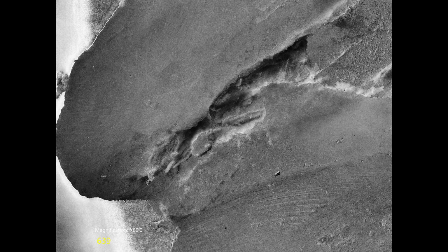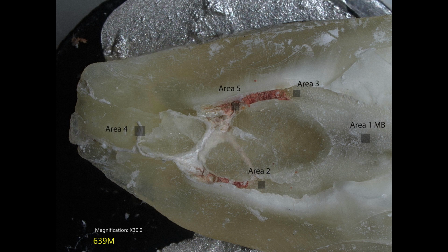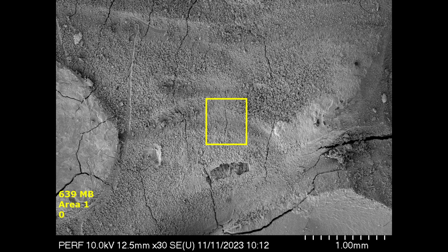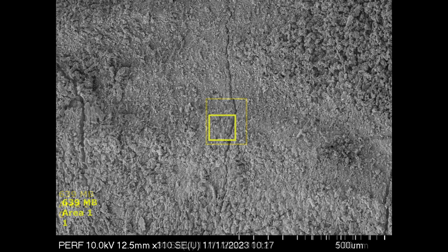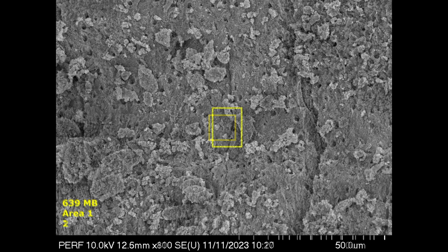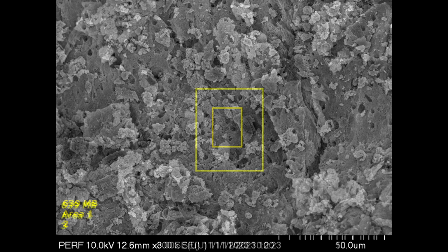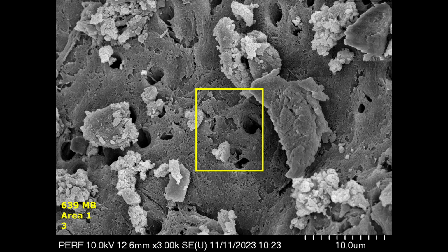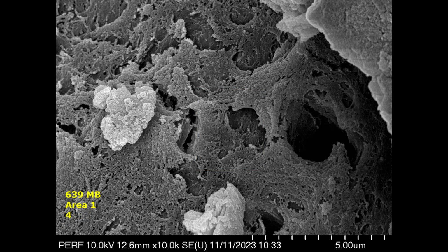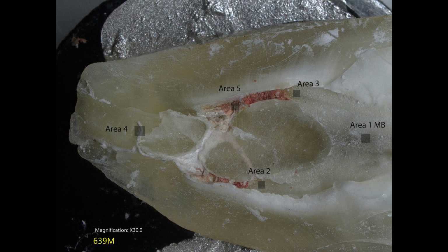And when you go into these sections, it was very interesting. Although there was a lot of tissue, it was very difficult finding microorganisms. This is up near the coronal part of the mesial root, and when you go into the tooth and examine it closely, it looks like most of the predentin was pretty much dissolved, demineralized away, and actually the mineralization front showed quite a bit of demineralization taking place.